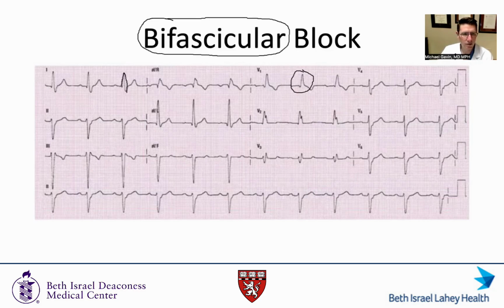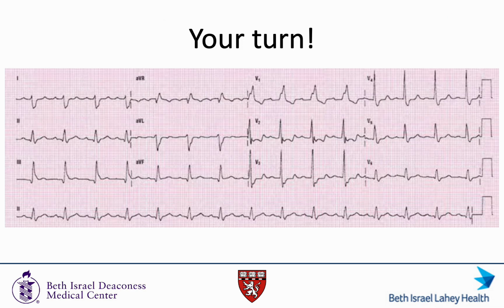And then you occasionally hear the term trifascicular block, which is a total misnomer and refers to also having a prolonged PR interval. But the PR has nothing to do with the left posterior fascicle, just either slowing in the AV node or in the His. So that is a term that can be confusing, probably to be avoided, and actually exists here because the PR interval here is not normal. That's prolonged.